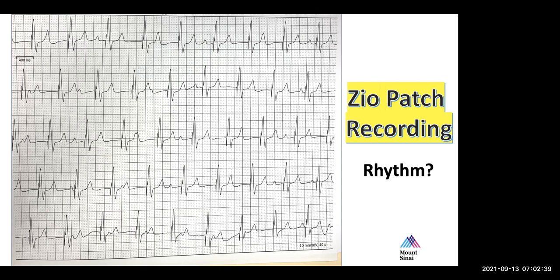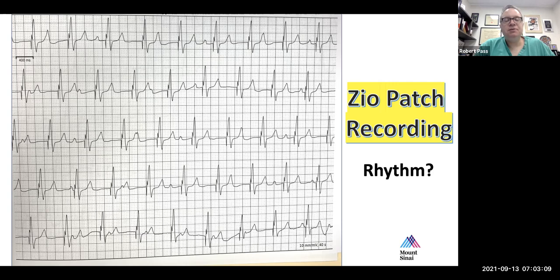There is a sinus rhythm, but with, yeah, it looks like a delta wave. So WPW. Okay, so you're suggesting this is WPW.